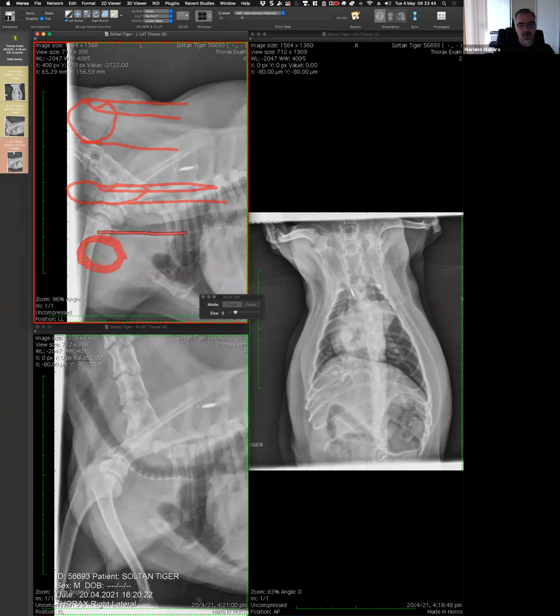So then you're going to have one line here, one line there. That's given by the wall of the trachea and the surrounding tissues, or the mineralization, like in this case of the rings. And then you have a thickened wall, and then a line there, and a line there. And again, technically, you can see that line because this is soft tissue against gas in the trachea. Okay, so this is just thinking aloud about your comment with the trachea.